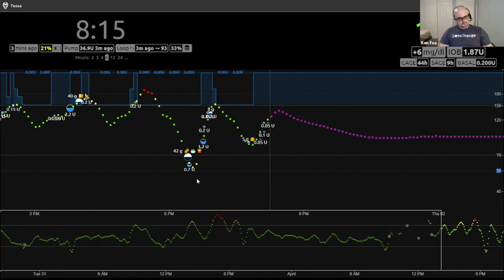So I encourage you to set these numbers up, maybe not super unrealistically. Some people like to set them really tight, like 80 to 110 or something like that, which is fine, but give yourself a little bit of leeway. People are comforted by seeing green. So figure out a good balance of how much green you want to see. But don't overdo it. Don't make it like 300 or something. Probably wouldn't be as good. But use the colors to inform you.